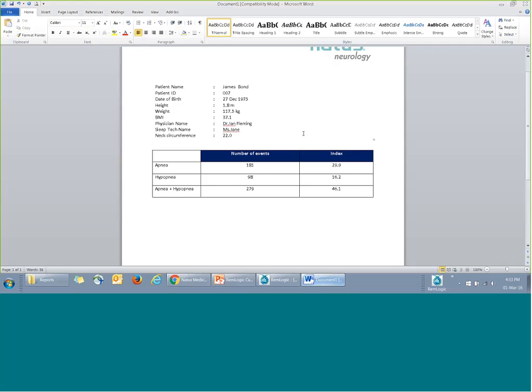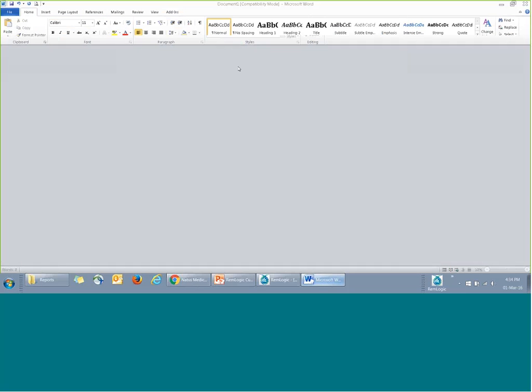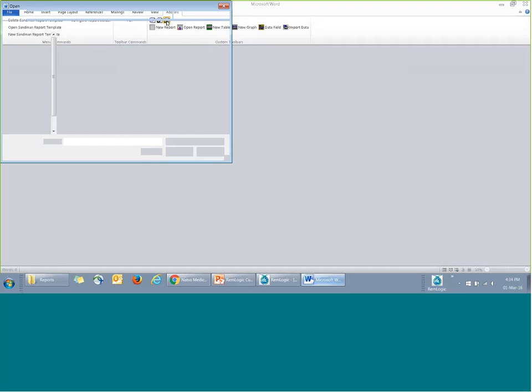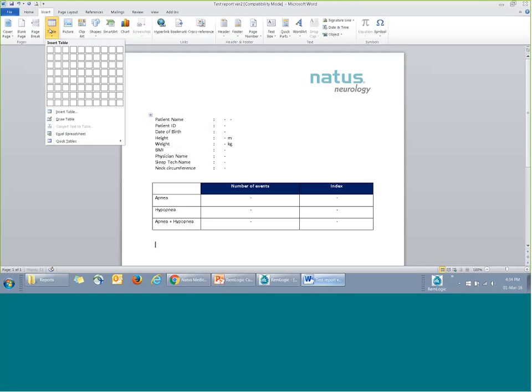So what else can we do? Let's try to add in a graph, shall we? Oh no, let's do something else. Let's try to add in another table here. Let me just close this generated report. For example, let's do this. I'll insert 3 sections.